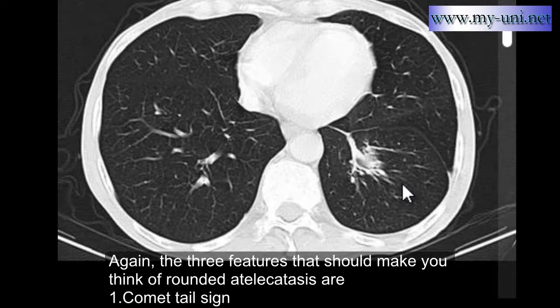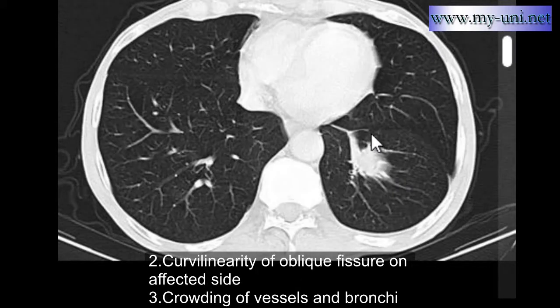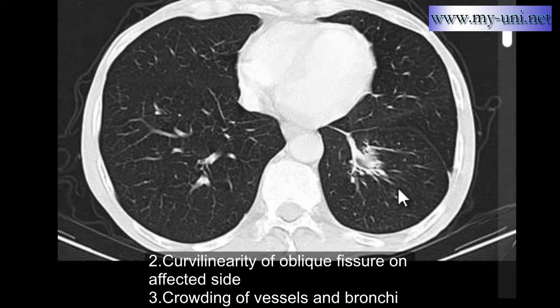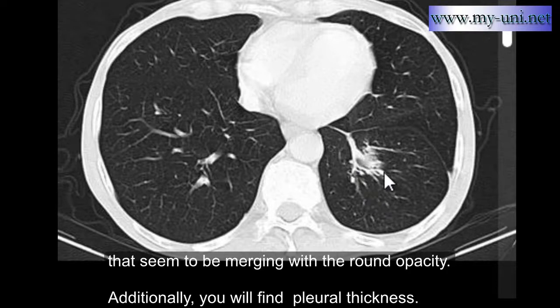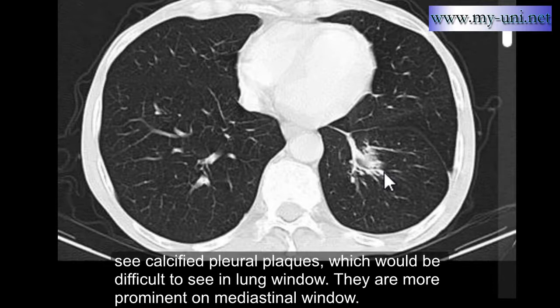So again, the three features that should make you think of rounded atelectasis are a comet tail sign, curvilinearity of the oblique fissure, and crowding of vessels and bronchi that seem to be merging with the round opacity. Additionally, as I said, you'll find pleural thickening, and you'll also find that around 70% of such patients have a history of asbestos exposure in past, and if that is the case, you may frequently see calcified pleural plaques, which would be difficult to see in lung window. They're more prominent on mediastinal window.